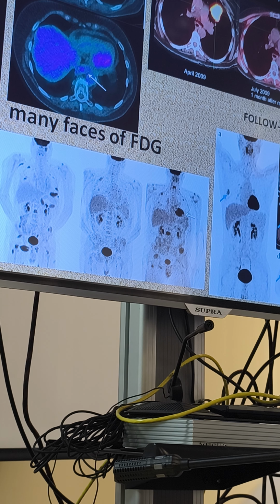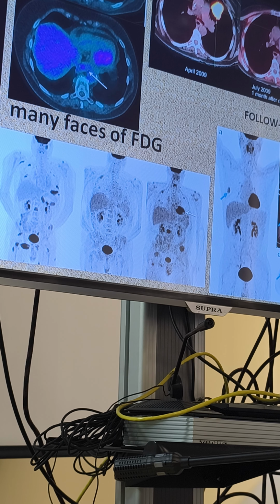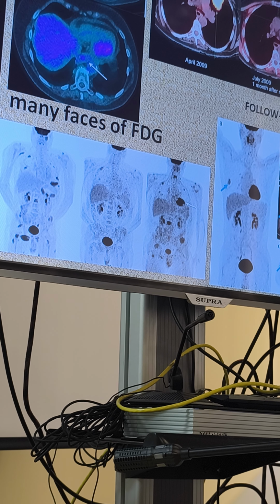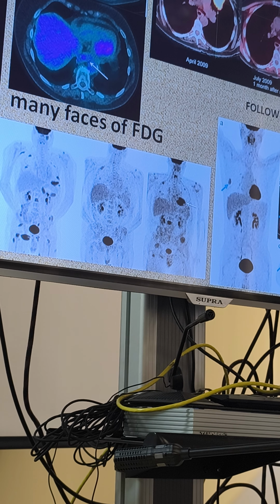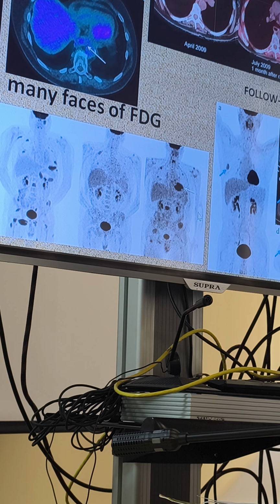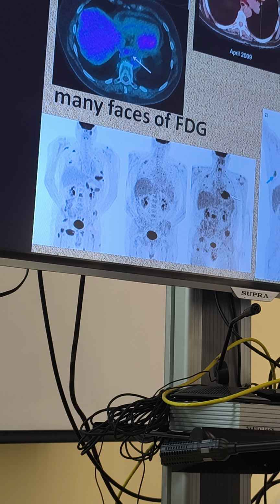They see fewer lesions and they are taking up less. But unfortunately, 4 months later, it appeared to be a failure again, because we have even more lesions than on the initial staging picture, and we even have a specific tumor in the heart of the patient, and this is a really bad prognostic sign. So this is how it can work.